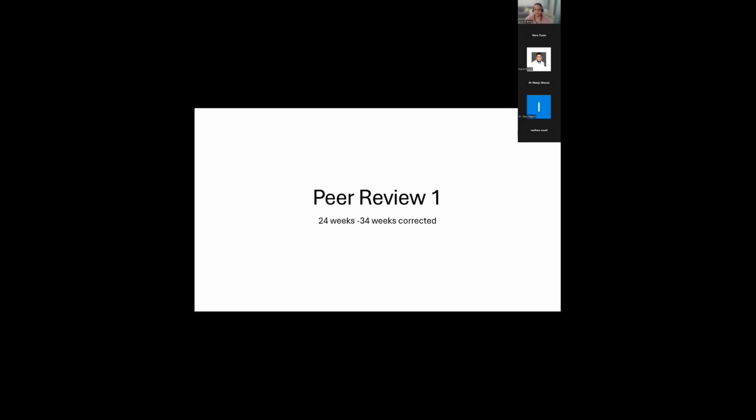So let's make sure. Okay. So what is peer review? Peer review is basically a really good way of us being able to assess, look at scans, and quality assure that the scan, from our perspective, captures the images that we need. But more importantly, what is really important when we do peer review is the ability to clinically correlate. What I'm showing you at this particular point is a slide of a 24-week baby who is 34 weeks corrected. And I'm going to take you through the coronal views.